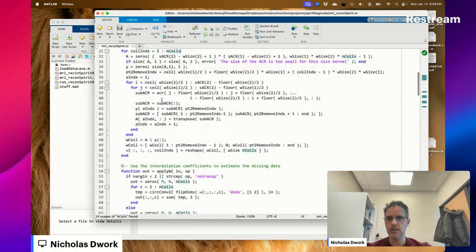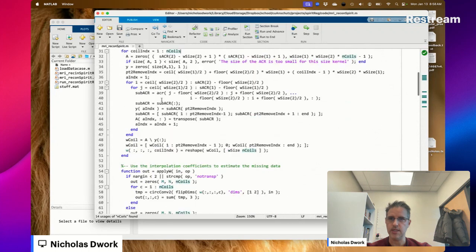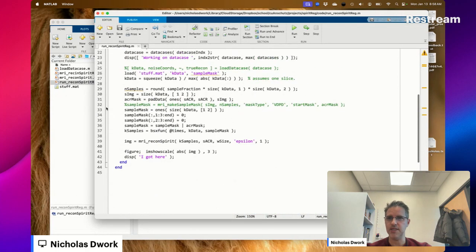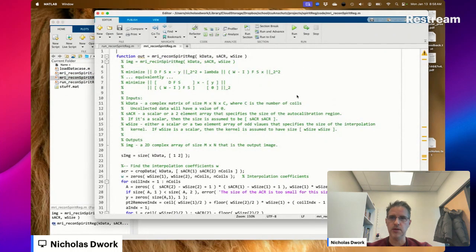Oh my goodness. I just deleted a bunch of stuff. I just closed a bunch of stuff. Where is this? Okay, well, let's see. Hopefully I didn't save anything that I just changed. Oh my gosh. More than one bug already. I guess we're outputting image here, not out.